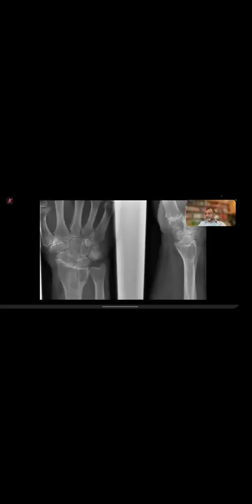Okay, another example. What do you think is happening here? This patient was sent to us from a DGH because we were the bone center at that time. They asked, is this a giant cell tumor? The patient was in their 60s. Do you think it can be a giant cell tumor? Yeah, very good. Because we are discussing CPPD, this is probably a large geode.